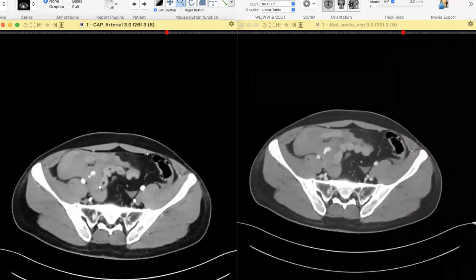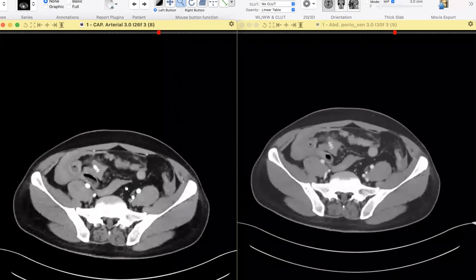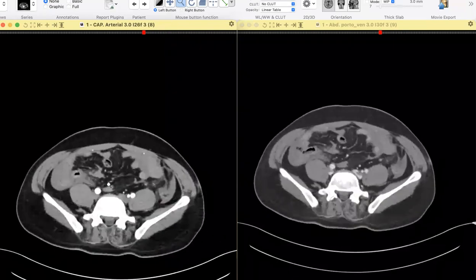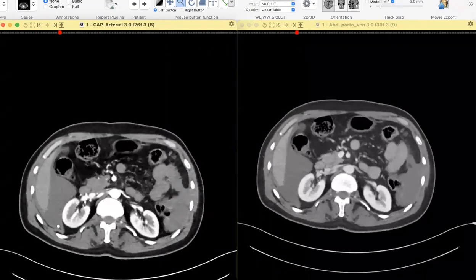So this does not have any management with interventional radiology. This goes directly to surgery and surgical management. They did a jejunal resection and anastomosis for this case. There were two large mesenteric tears. When you say ascites, you're already thinking of internal hemorrhage in this patient. Just say dense ascites. Okay.